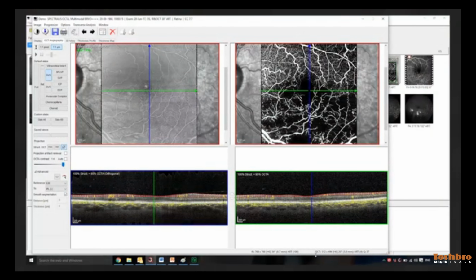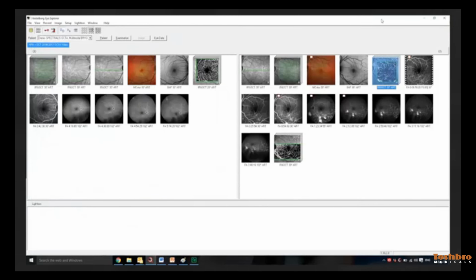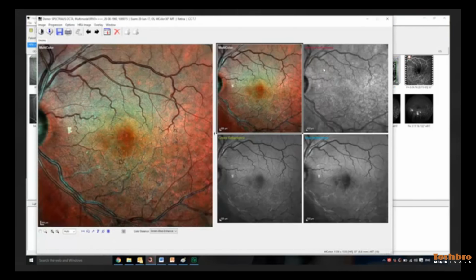Although OCT angiography gives very nice images, it's important to understand that it's giving limited information about flow in the vasculature. It's important to interpret this with other imaging modalities to gain additional information. Colour photography would be particularly useful for signs such as exudate, and this may give an indication of the chronicity of a disease process. This information would not be gained from OCTA.